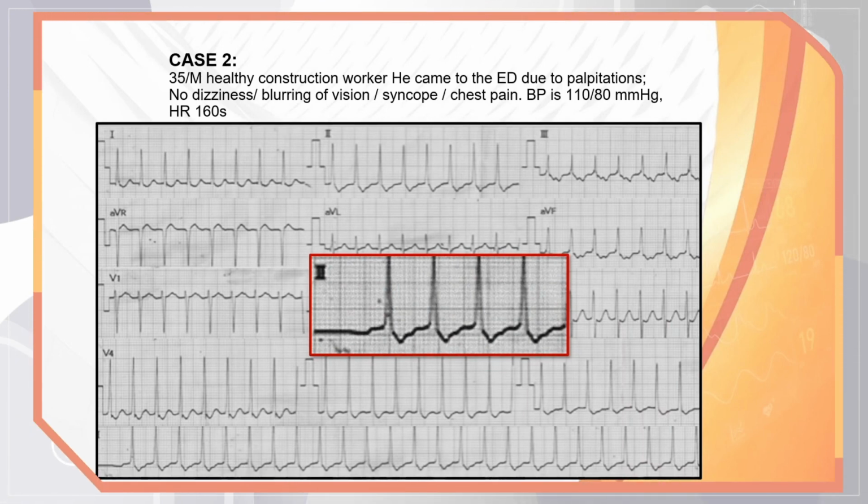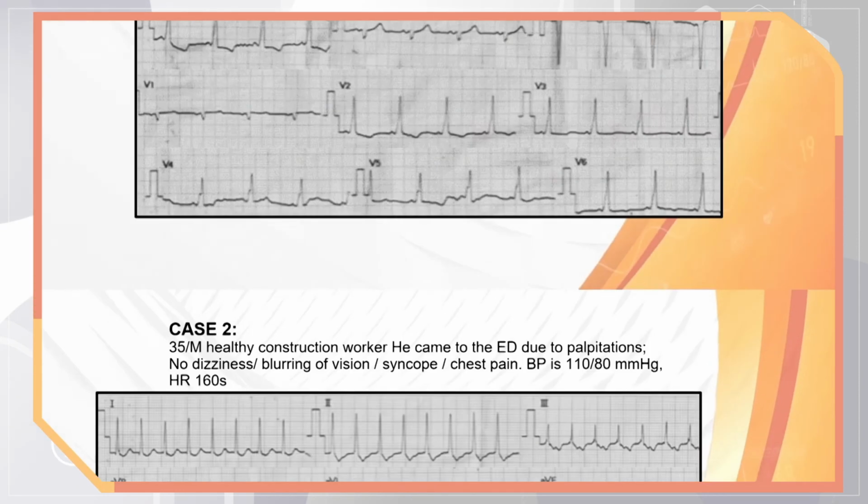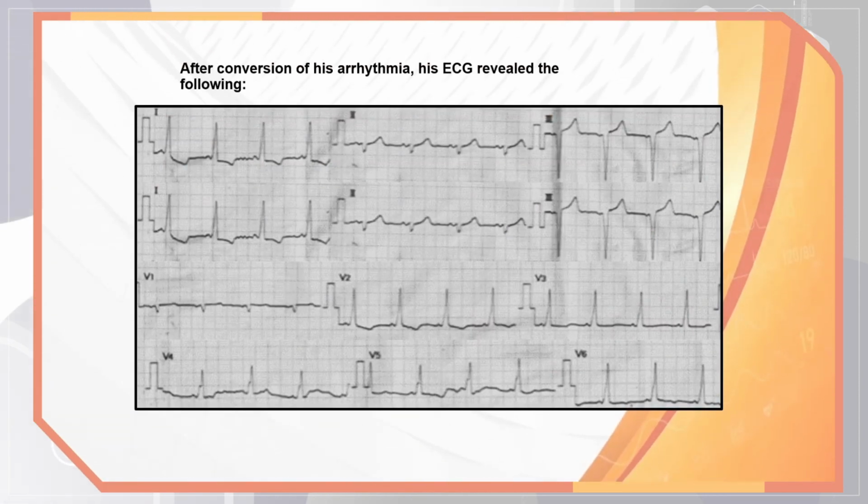tachycardia. Now, this particular patient underwent a cardioversion. He was converted back into normal rhythm, and this is his ECG after conversion, and it shows two peculiar signs.